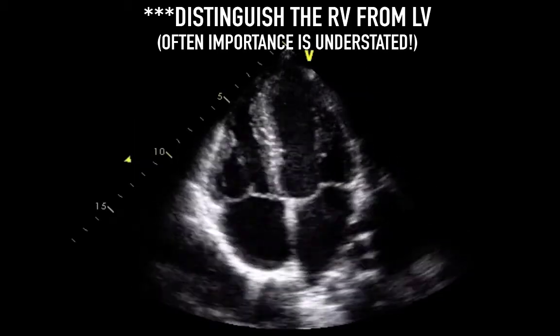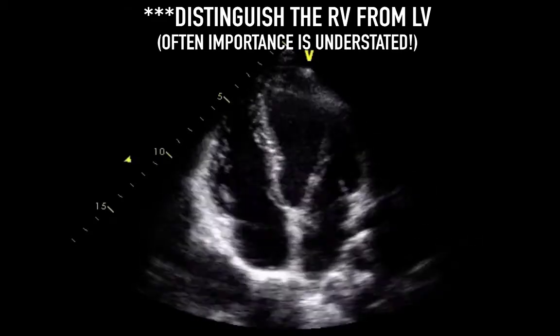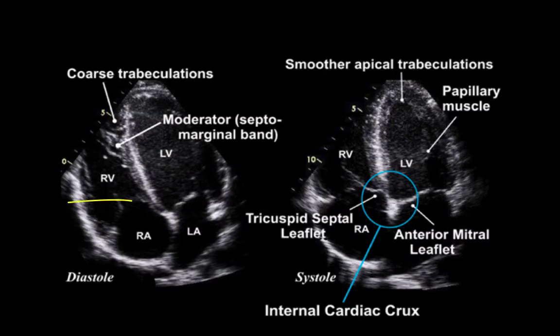Also important to take home is how to distinguish the RV from the LV. By now you may have realized it can be really easy to get confused over which chamber is which. This is especially true if you're not performing the ultrasound. Some key things to consider. The tricuspid valve insertion is more apical than the mitral valve. Generally speaking, the LV forms the apex.